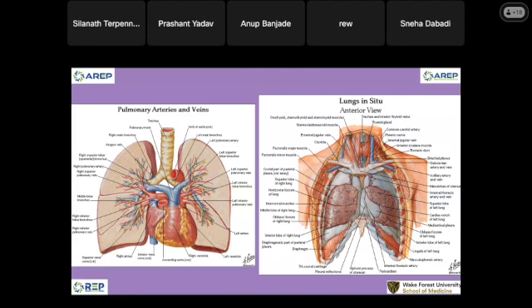Okay, I think we are done with the coronal CT. I'm not going to talk about the lower extremity. They are the same raw data, but today we're going to focus on the chest scan only. We use axial images to do reconstruction. So you are seeing something that's already manipulated by the software, but this is the real raw data that we get at the beginning.